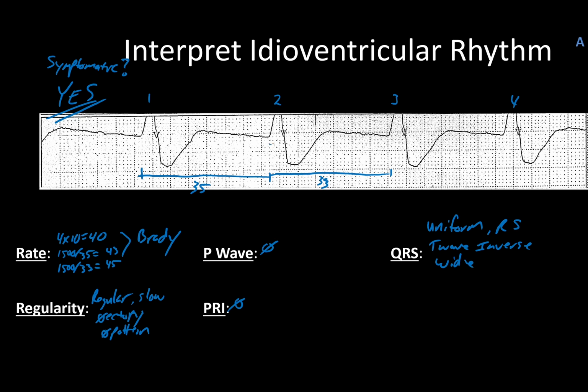Well, we'll start measuring right here. I'm going to say that this is my J point, where it comes sharp and then goes horizontal. That little corner there, which marches up to about this spot. 1, 2, 3, 4, 5. 5 times 0.04 equals 0.20, which, just like we said, is wide.